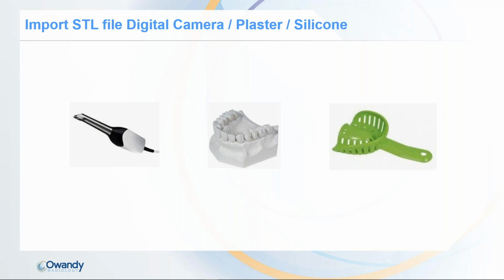And we'll see the different ways of getting an STL file with a digital camera scanner, or from a plaster model. We may use a plaster model directly on the device to recover an STL file, and we may also scan the silicone mold on the CBCT itself.